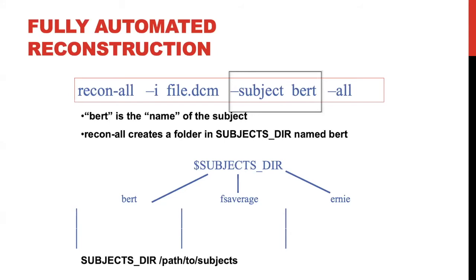And so you just want to make sure that you're giving distinct names, because like I said, if you have Jenny in both Alzheimer and control, you want to make sure that you're not overwriting anything, and that each subject has a unique name, whether that's unique to its pathology or however your naming conventions work with your studies. It's just important to give it a unique name.